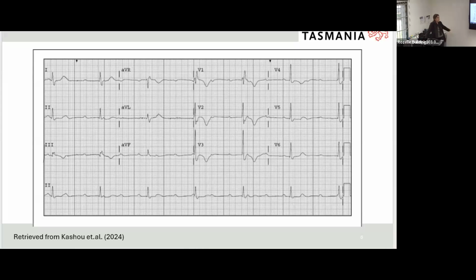Yeah, so basically you have to have the T wave following the QRS, so you're going to see that, but you might not see the P wave if it's been hidden by the T wave. Got it. So it might change the shape of that T wave. It might, depending on, okay, cool, thanks. And we do see that because we see a different shaped T wave in all of those leads.